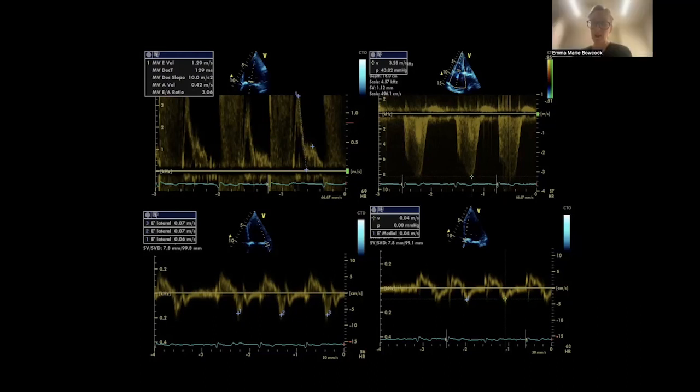Yeah, nice. So you're in the middle pathway, aren't you? Because we're not using her E to A. I think that's an error in that measurement. Yeah, but then if you're not using her E to A, then you could never say she's got severe diastolic dysfunction despite all the other parameters, can you? That's right. That's a problem with the guidelines. I don't suppose it matters because you want to know whether she's got raised left atrial pressure or not. Which she does. But you're exactly right though. For the purposes of the guideline, she would fall into that middle category.